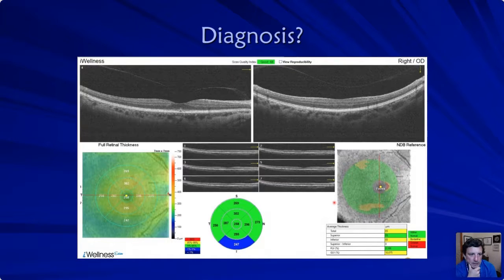And it's not a polling question, so I'm just going to give everyone a chance, and I'll kind of walk you through it. I see a little bit of a vitreomacular adhesion. And then I go, oh, vitreomacular adhesion, there's supposed to be no tissue disturbance. And then when I looked at it a little bit closer, I said, I don't like this tissue disturbance. And this patient's acuity might have been 20/20 minus, 20/25. And just kind of looking at a lot of OCTs over the years, I said, you know what, this doesn't look too bad. Vitreomacular adhesion, nope, I'm going to call this a vitreomacular traction based upon this patient's morphology change, the retina change, vitreomacular traction.